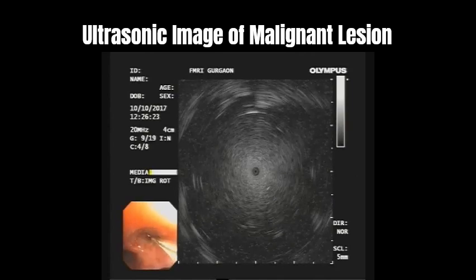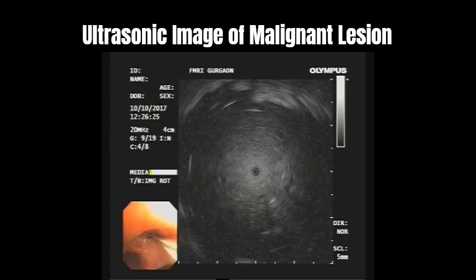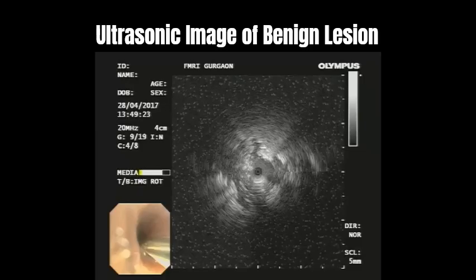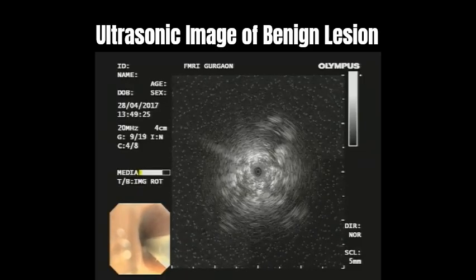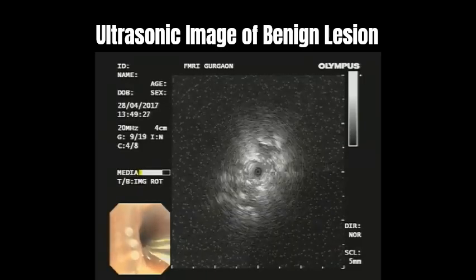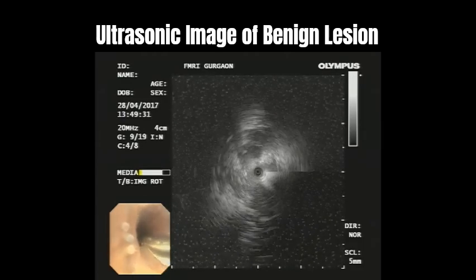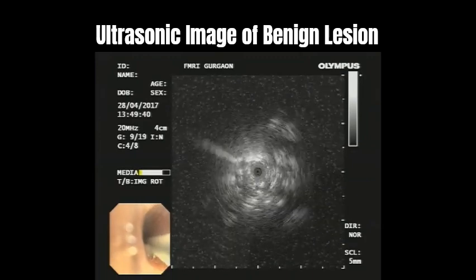There is no air bronchogram, which is a distinguishing sign for inflammatory disease or atelectasis. Ultrasonic image in benign lesions shows blurred margins, heterogeneous internal echoes, hyperechoic dots, and arcs and concentric circles.